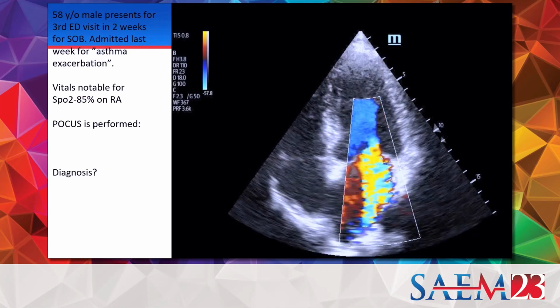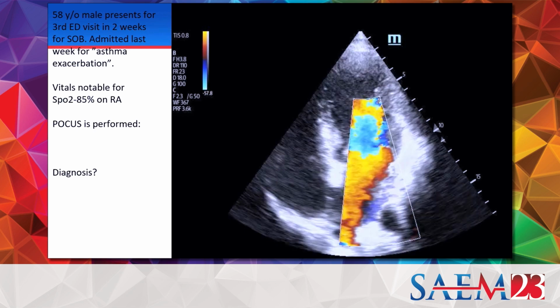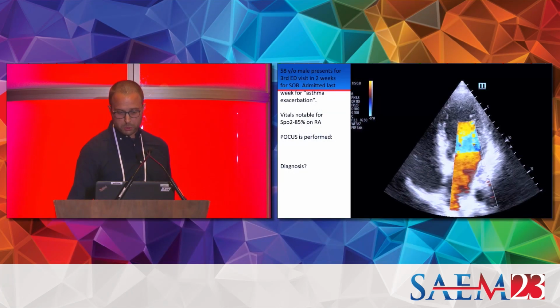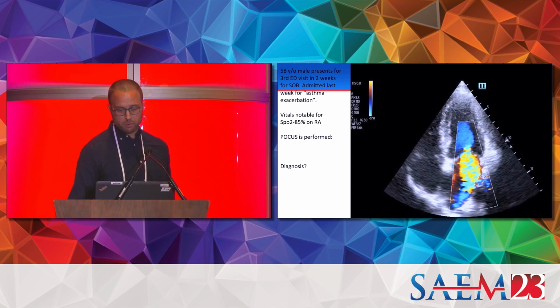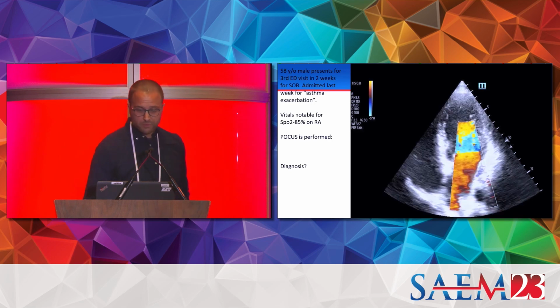Severe mitral regurg, exactly. So if you look at the jet here, we have our color Doppler. It's centered over the left atrium and the mitral valve. We're seeing that we have an eccentric jet here, and it's actually reaching the back of the left atrium and actually wrapping around and then moving antegrade again. It occupies greater than 50% of the left atrium.